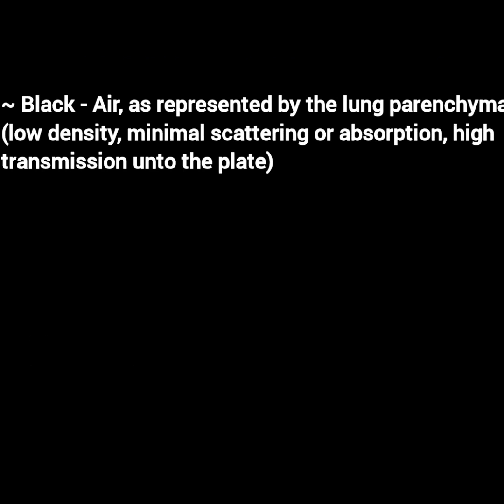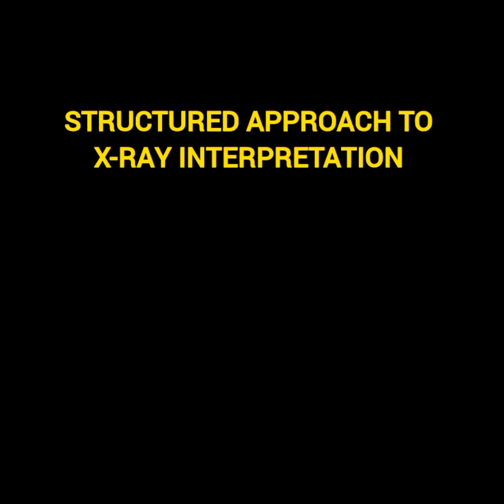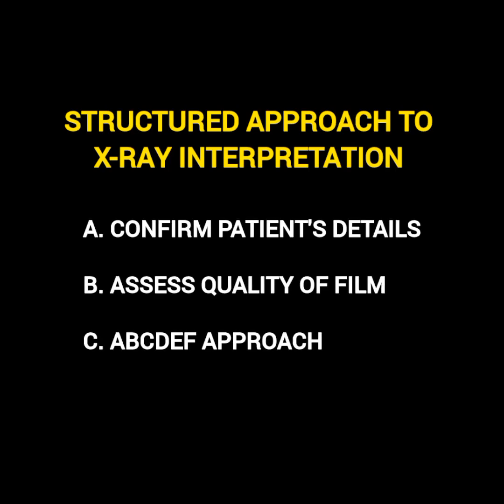The structured approach to X-ray interpretation. A: Confirm patient details to be sure you are dealing with the right patient. Assess the quality of film. Then the ABCDEF approach is used in interpreting the chest X-ray.